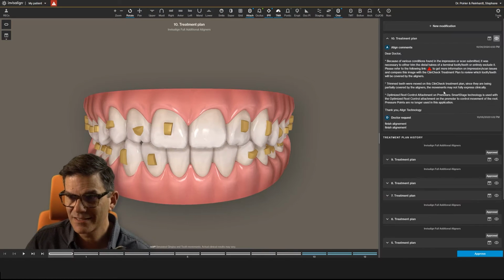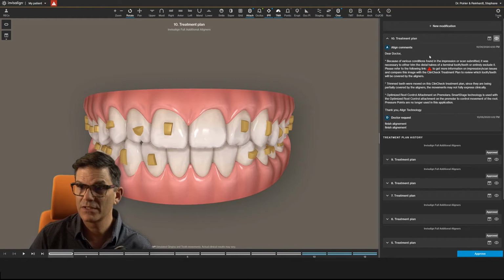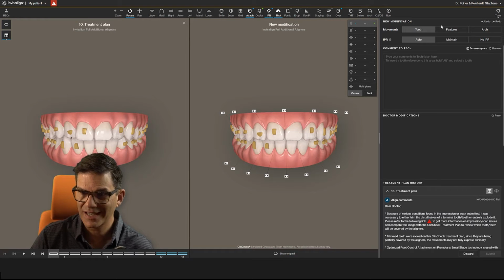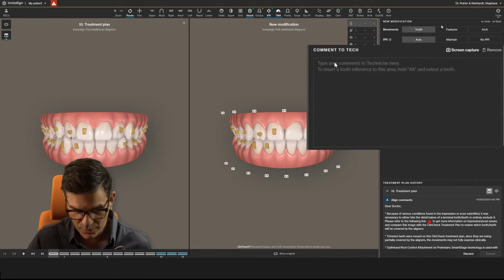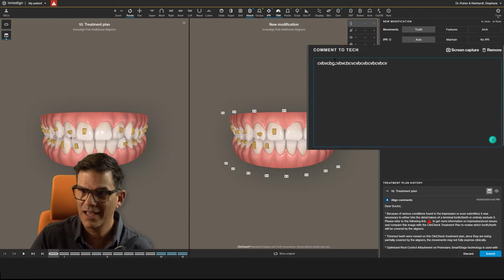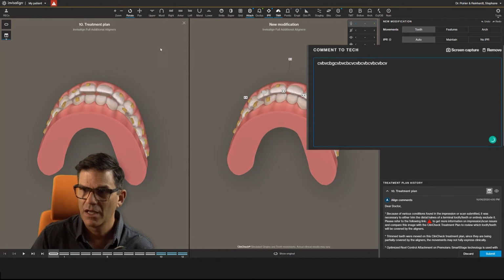Okay, let's say in this case that I want to communicate something to the technicians. There's something I want to change. I want to modify things. Now, if I don't want to do it myself, I just click here, comment to tech. I write what I want to do. That's it. It's there, and I just submit when it's done.